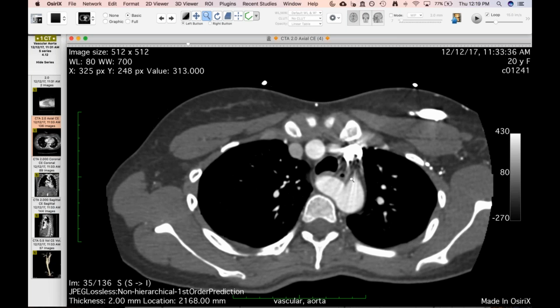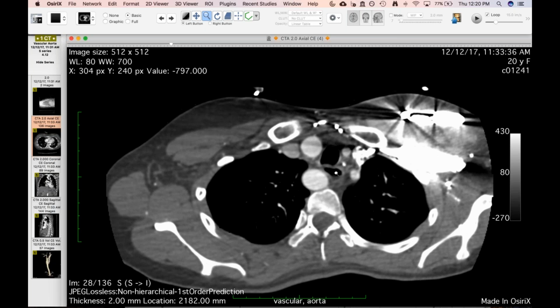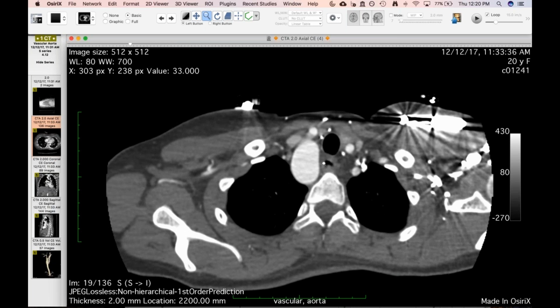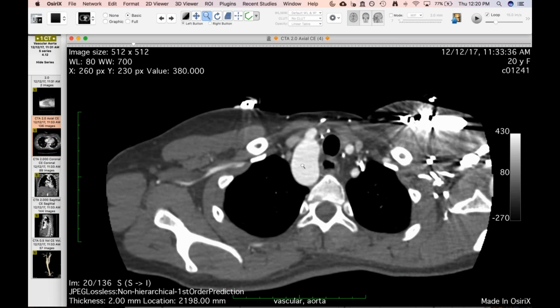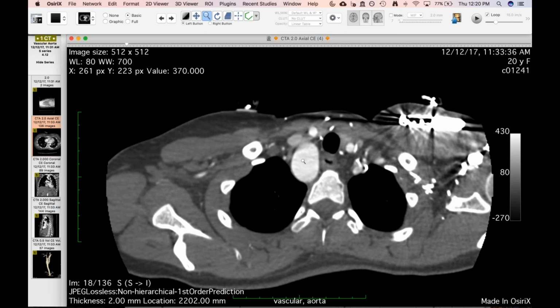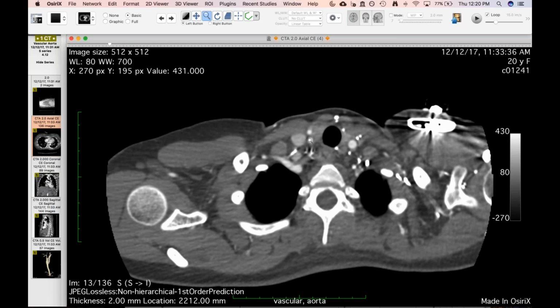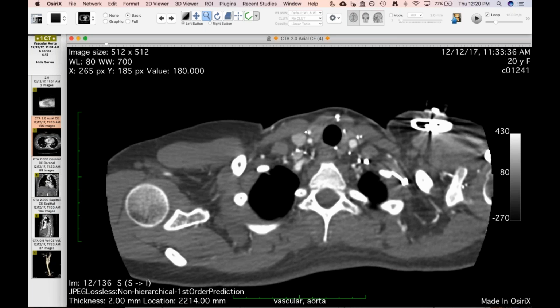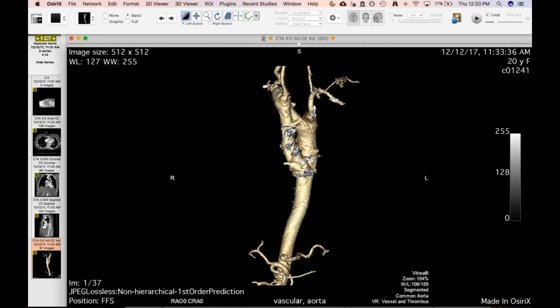And so this is a patient also with DiGeorge syndrome. I think, is that what your patient had, the one that you showed? That's right, it was DiGeorge. Yeah, with a 22q11 deletion. And I think this is probably the most convincing cervical arch I've seen, not quite as high as yours. The other thing is, you can notice how early the carotid bifurcates, and some of the cervical arches you'll have separate ostia for the external and internal carotids, and it's nearly what the case is here.